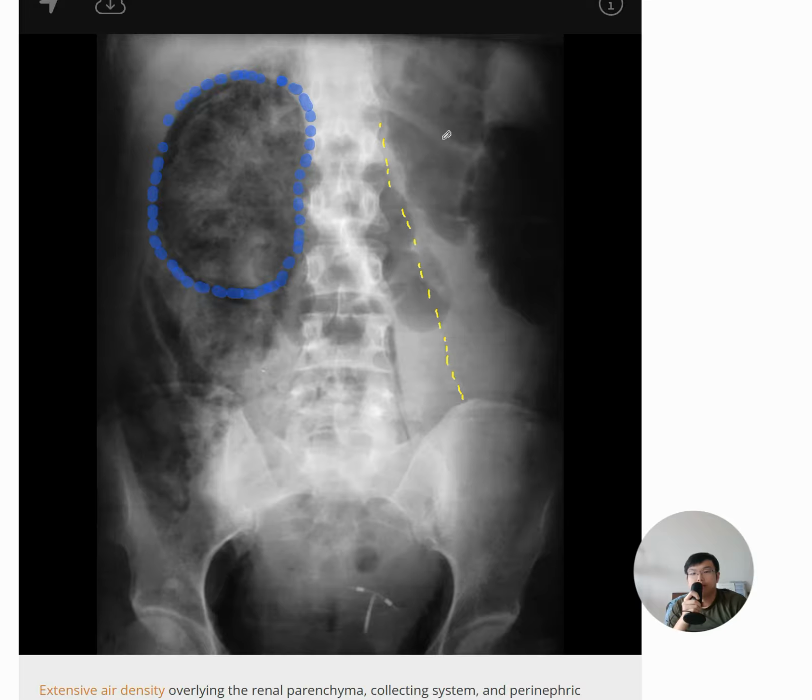Okay, there are two main things that we expect for a kidney on a radiograph. First of all, it is aligned parallel to the lateral border of the psoas major muscle. Secondly, the bipolar renal length is around 2 to 3 vertebral levels, just like this. Okay, so if I draw out the normal one, you'll immediately appreciate that this is grossly enlarged.